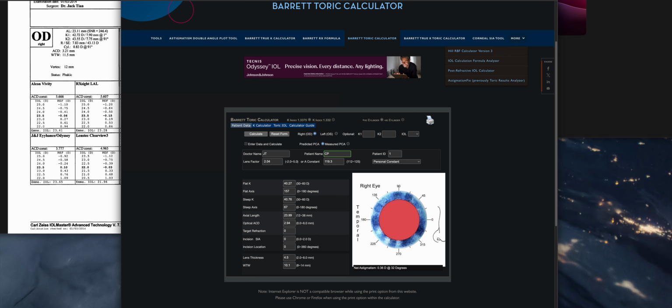Okay, so this patient's initials, doesn't matter, you'd obviously plug in their MRN there, and of course these numbers are going to be the same. We're still going to do the Odyssey lens. Okay, so we're going to plug these in.